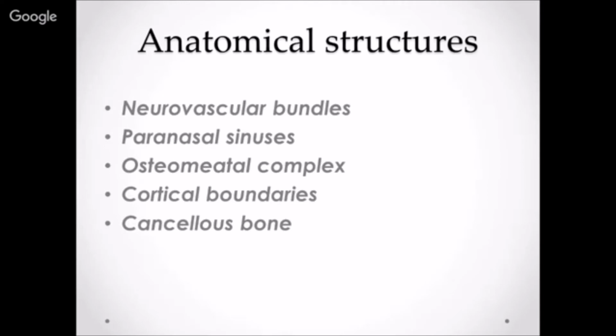The cortical boundaries of the implant site, or in general as such, indicate the intactness of the bone. There are various other disease processes that can be assessed from the cortical boundaries. We'll jump into that a little bit and give you a brief idea. But the cortical boundaries give you an idea to assess the amount of bone, as in the first slide that I showed, the quantity of the bone. So when you have enough thick cortical boundaries, when it's well described, you know there's a very good chance that you have a good healthy bone inside.